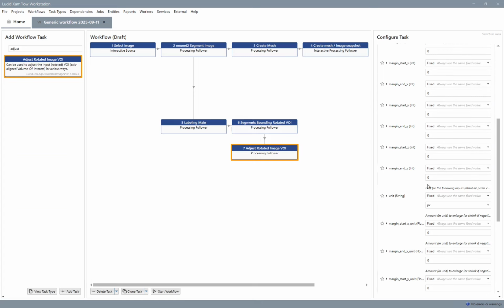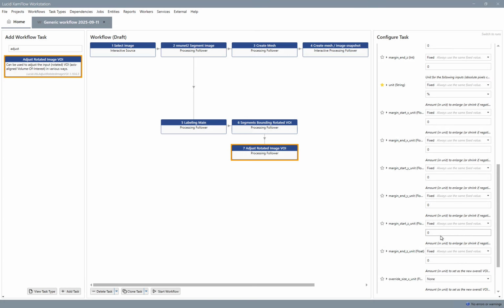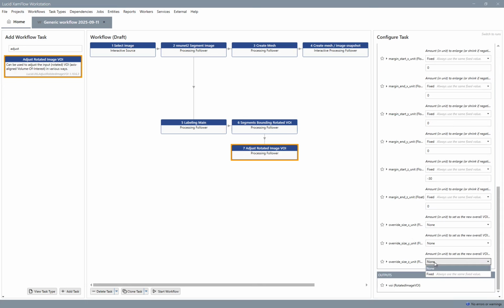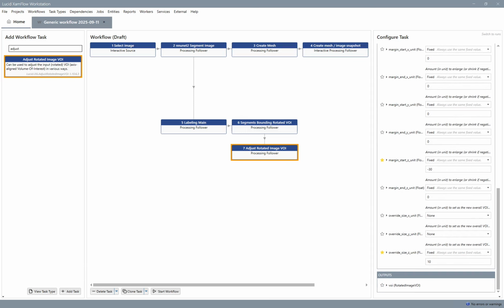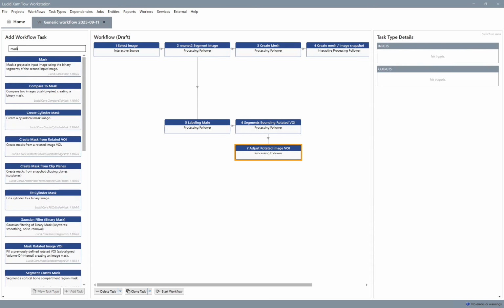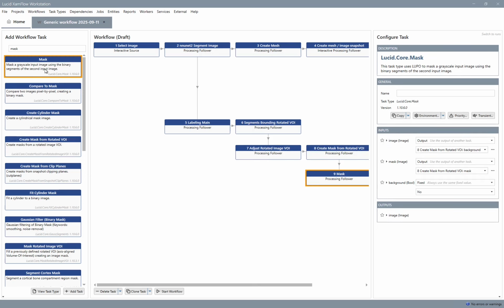At this point, we could add any number of analysis and calculation steps. In this video, we just remove a 30% margin at the start and override the size to a fixed 10% of the total bone length. To avoid resampling the image data, we instead create a binary mask for the volume of interest and use that to mask out the relevant part of the full bone mask.